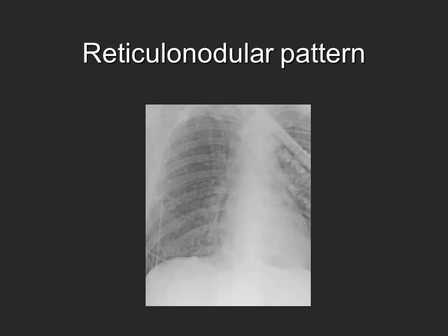This is a close-up view of a reticulonodular pattern of interstitial disease. In addition to the innumerable thin white lines of the reticular pattern, tiny white nodules are also seen.